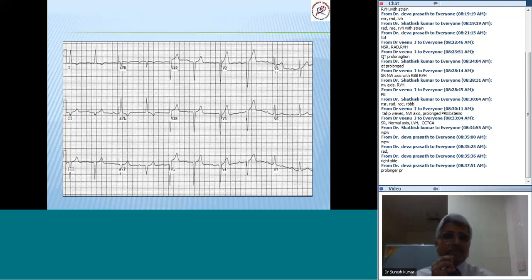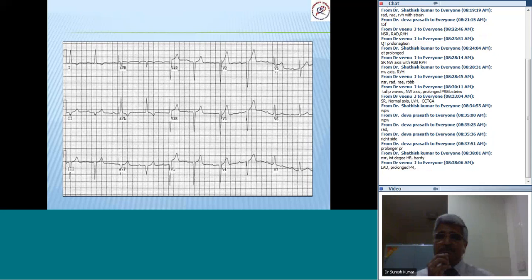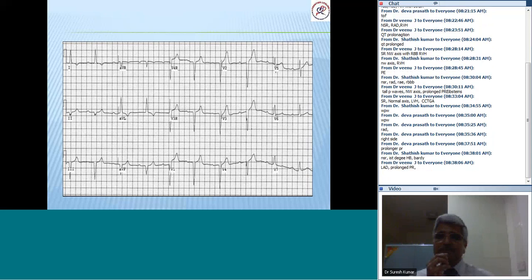Yes, PR is prolonged, but you saw only the PR prolonged, Deva Prasad? You're trying this, now you're spotting more and more things. I'll have to put together all the answers and reach the correct one. Can anybody give me a diagnosis on this?